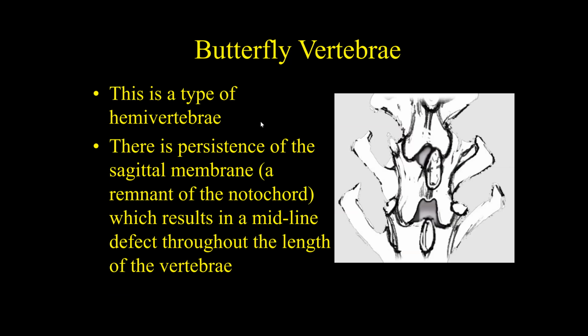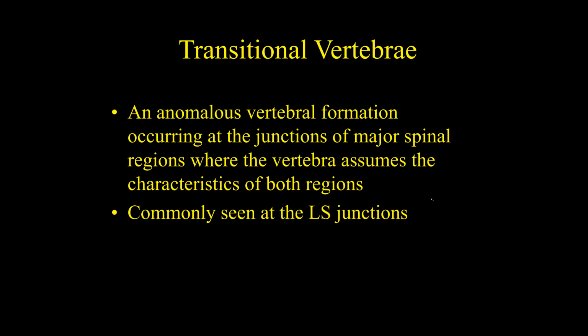The butterfly vertebrae is basically another name for a hemivertebrae. If you look on the VD view, sometimes they will take on a butterfly shape.